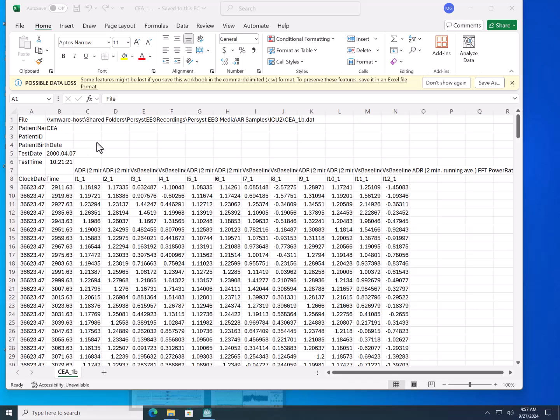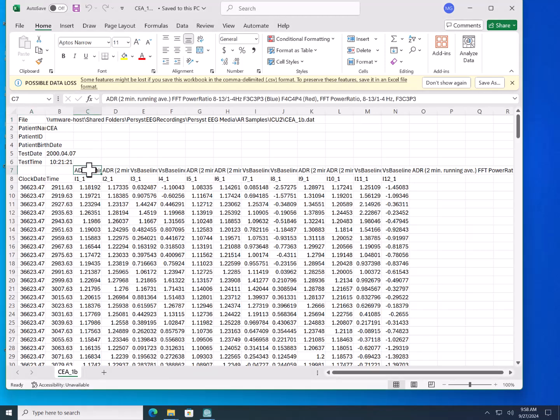What we have here, when we use the default Excel settings to open the comma-separated values, then, of course, using those comma-separated values, you get nice columns for each one of these. Now, the labels are up at the top, and they stretch over because each one of these has more text than would fit there, but you can just arrow over and see what each one of these columns is showing.